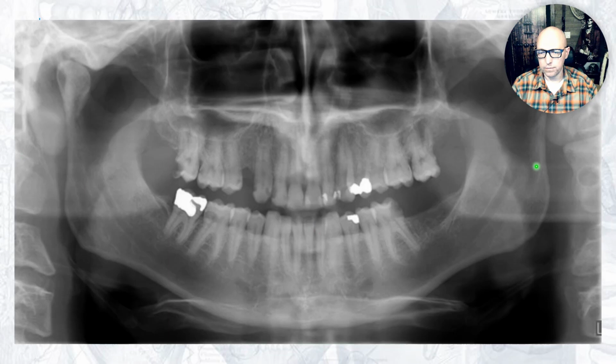Everything is in focus though. Got my big face over the condyle here, but it would show. You see both condyles, you see all the outlines of the mandible. You see a little bit of real image of the spine. Remember I said you'd see real image of the spine on either side? And ghost image is what you see in the middle, and it's blurred pretty much beyond recognition. Sometimes you'll see, like this, a gap between some of the vertebrae.